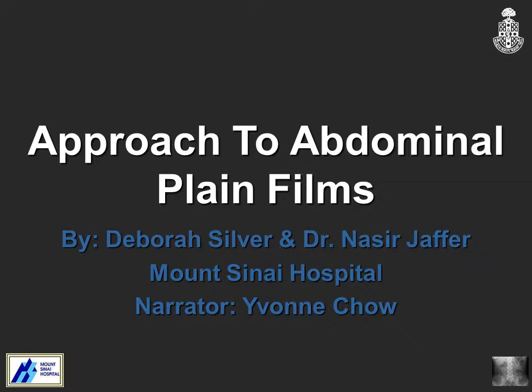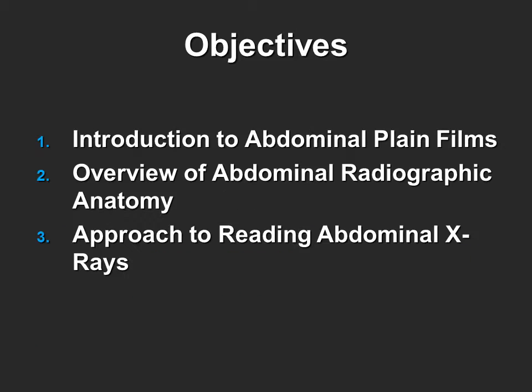Throughout the presentation, please click on the small abdominal X-ray in the lower right corner in order to proceed to the next slide. The objectives of this interactive presentation are to give an introduction to reading abdominal plain films, to review basic abdominal anatomy, and to give a basic approach to interpretation of abdominal X-rays.